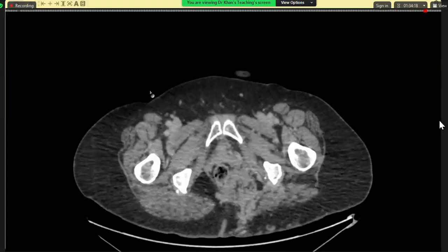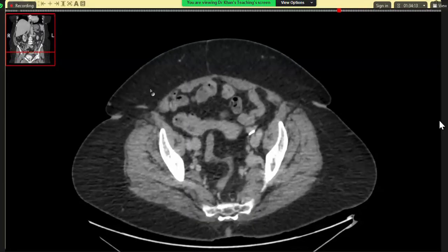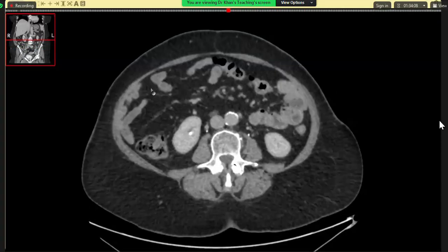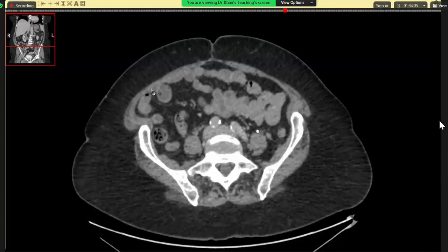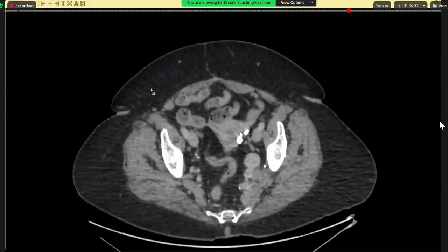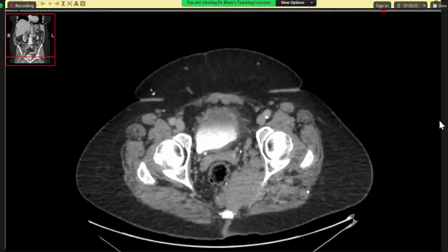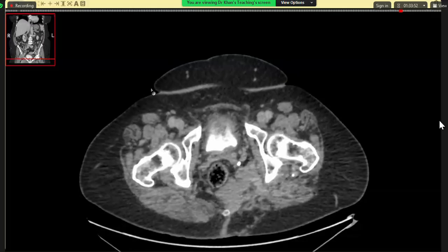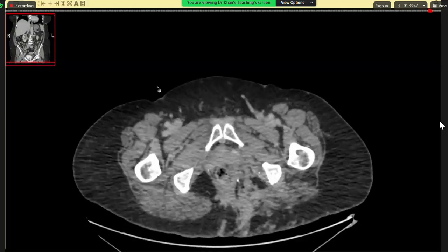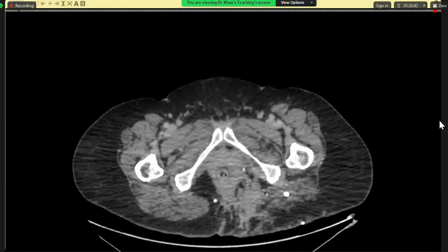So I will trace the left ureter once again. Okay, this is the left ureter, and as I scroll down, okay, I am not bothered about the KUB. We could not see anything. Anything else you see? Sir, urinary bladder is partially distended with no leakage of the contrast noted through it.